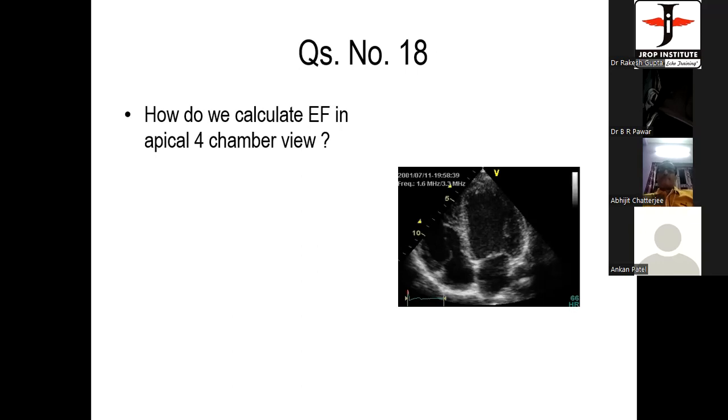Sir, during when the mitral valve is open, then LA size is reduced. No. Sorry, sir. You have to measure the left atrium and tell me whether it is normal, big or small. How do you measure it? Okay, sir. Normally it's measured in body surface area. If this is more than 34 ml per meter square body surface area, it is enlarged.